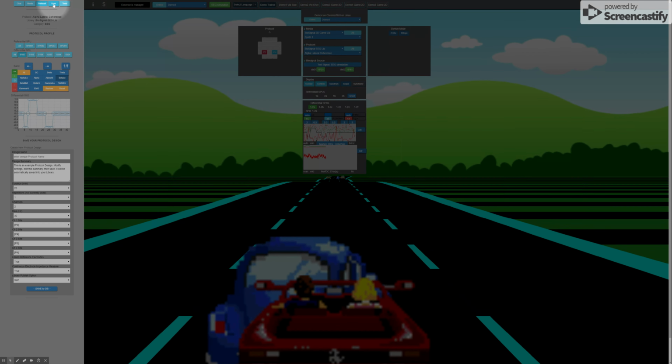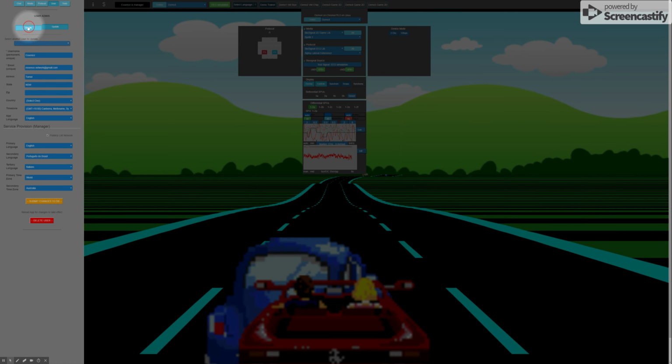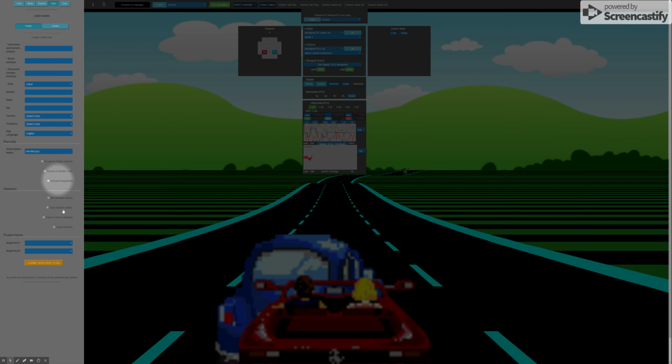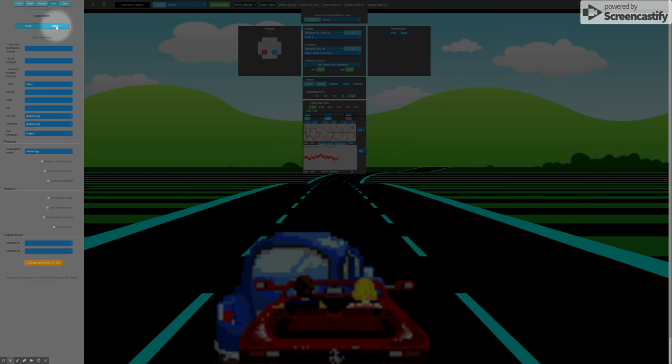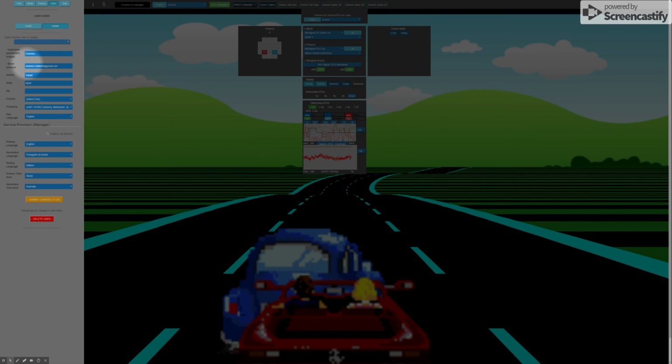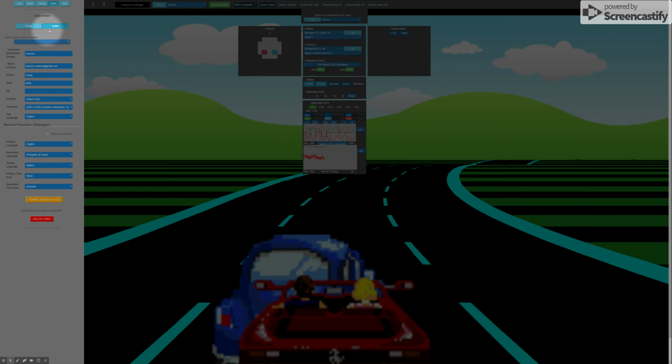The next tab is the user tab, where the trainer creates new users. His clients get registered here, or existing clients, they may have changed their email address or what have you, is updated there.